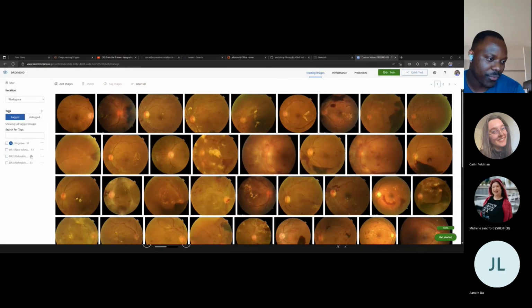Well, I guess that shows this is why. With this one, the images are very little, and so it's not ideal to have this. The data set is quite limited, and so it's better to have a larger data set, and ideally it's also good to have it as balanced. Perhaps if you want to take this a step further and record the amount of times you get DR1, DR2, DR3, you may find that one of the smallest amounts would be DR1, simply because your image balance is not the same. So that's a kind of bias there that we try to avoid by having a balanced data set. So that's the demonstration on the computer vision side.